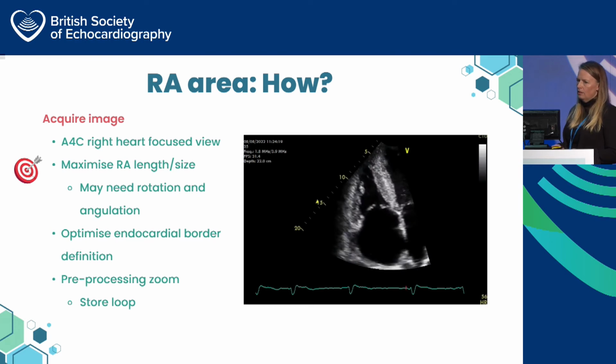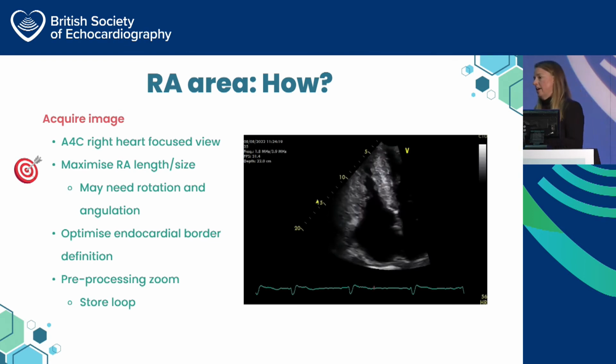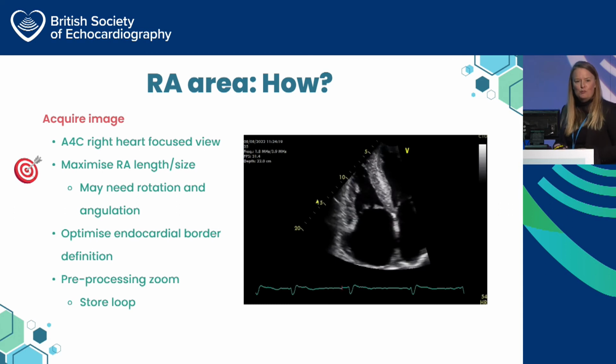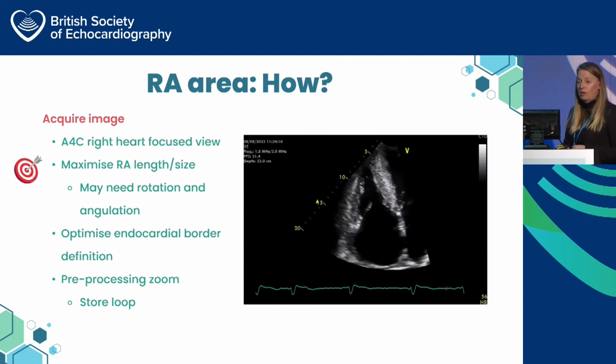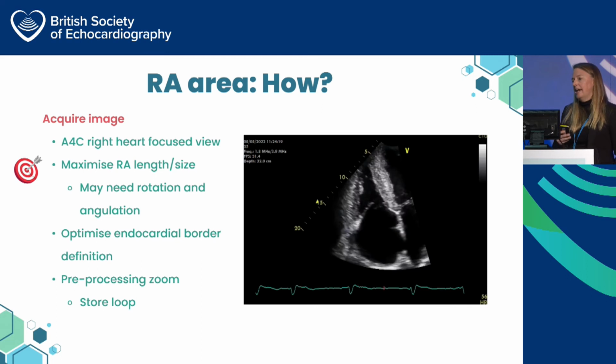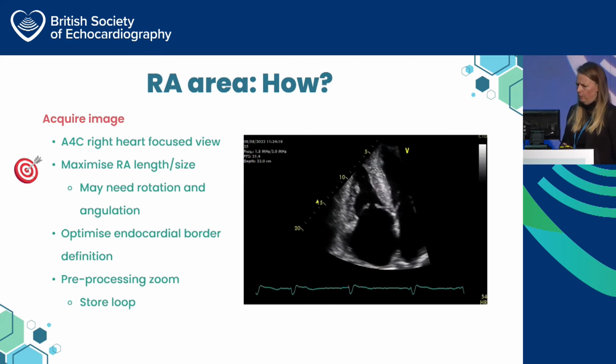So, moving on to right atrium. I'm not going to go through all of those concepts for right atrium and aorta as well, because we've gone through them now. I'm just going to rattle through the measurement bit with some tips of how to do the measurement well. So, right atrium area. As Dan has said already, you really need to get your right heart assessment done in an RV-focused view.